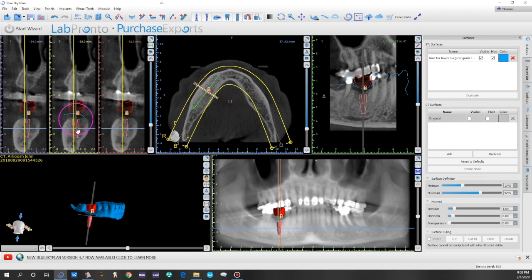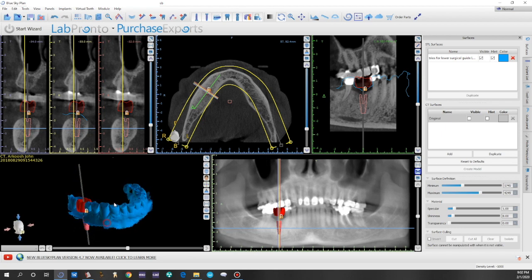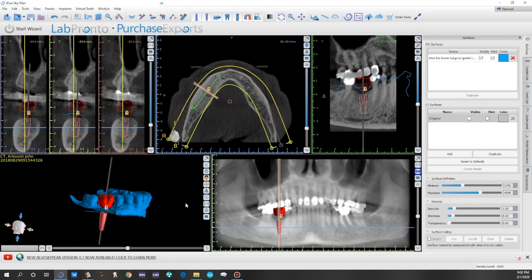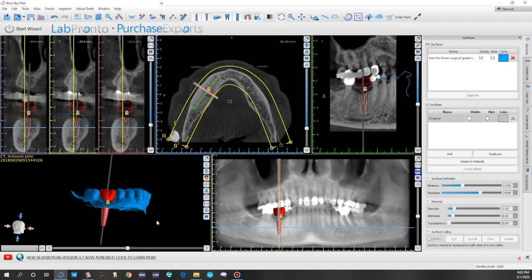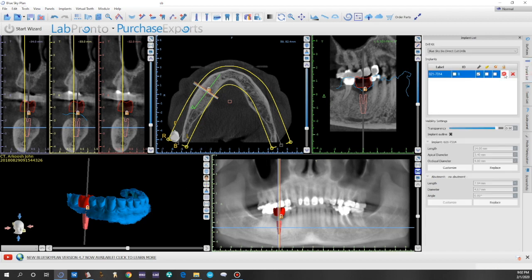And we just click where we'd like the implant to be positioned, and then you can use all the different panels there to help position the implant in the right location. Ideally, we want it to avoid any roots, nerves, and to exit the tooth right in the central groove of the design or planned tooth. We would also like it to have the right depth to allow proper emergence. In this case, there is already a vertical defect, so placing the implant flush with the top of the bone will be adequate.